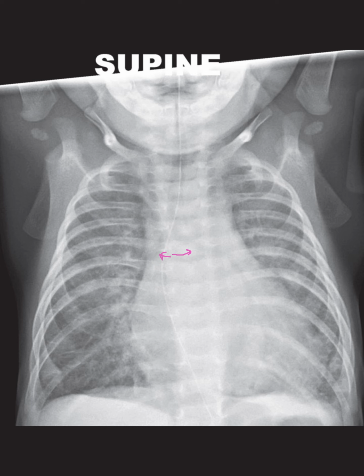First, there's a nasogastric tube, but the tip is in the distal esophagus and really should be advanced into the stomach for proper placement. Notably, the middle part of the tube deviates to the right as it passes behind the heart, which is an interesting observation.